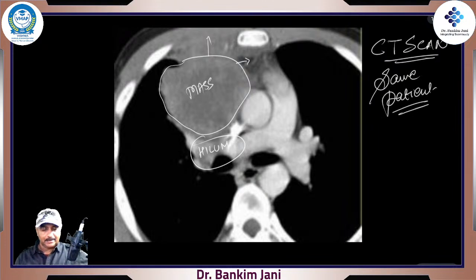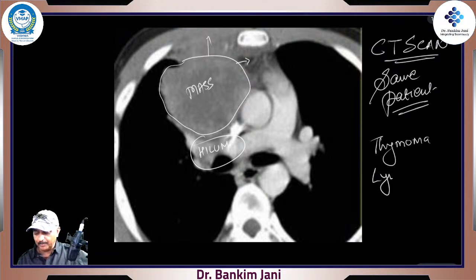And when it is in the anterior mediastinum, again, back to same. It could be thymoma. It could be lymphoma. The size itself is telling it cannot be a thymic mass. It has to be lymphoma, right? This is the thing. Such a huge mass, right? I'll show you even thymic cyst and everything, right? We'll see that. So this is how we really look at the picture.